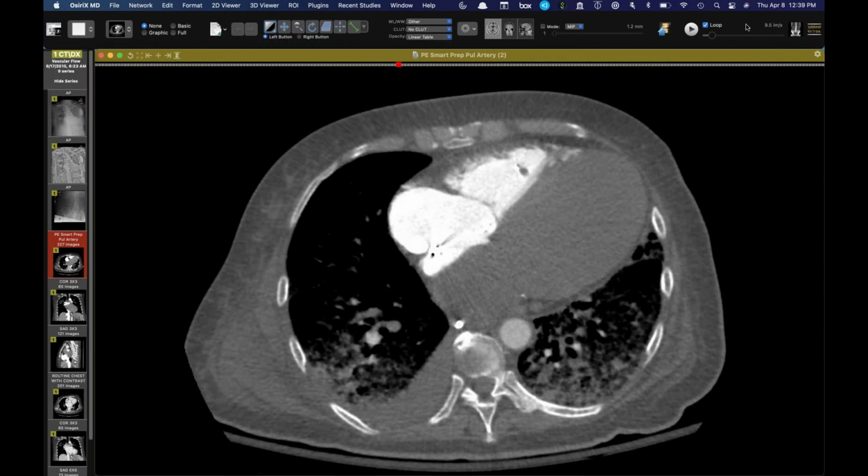All right, well, that's cool. That was the first one that you showed. The ventricle is pretty dilated. You think that's from the ECMO? Because we've shown some cases where you need to decompress the LV. Or is that from the infarct, or both? No, that CT was done when he was in the ED. He came in asystolic, was resuscitated in the field. That was relatively acute. And unfortunately, the patient passed a few days later, never regained function.